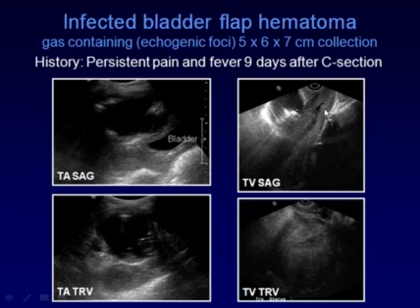On the transvaginal, it's actually a little bit harder to see the whole uterus because it was large and out of the plane, but you can see the collection with the bubbles of gas which are now rising up. The patient is lying down, and there's a little bit of complex fluid in the endometrial cavity.